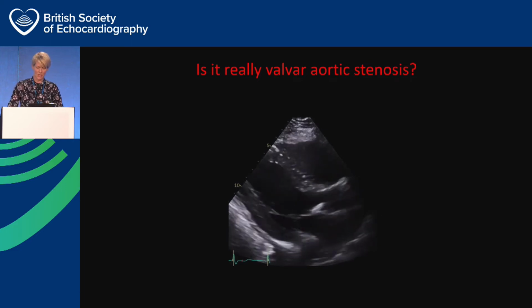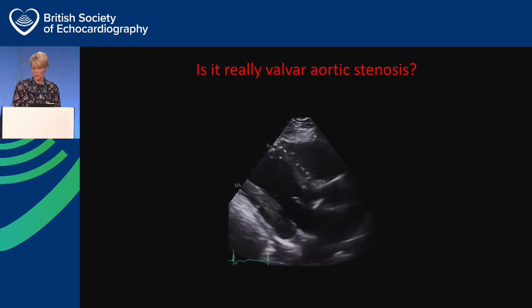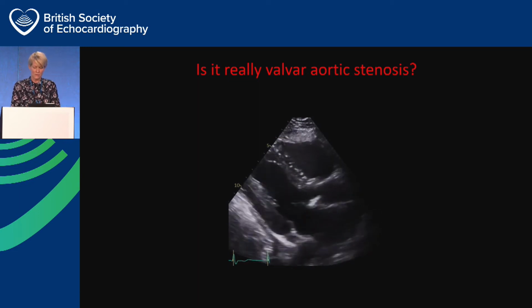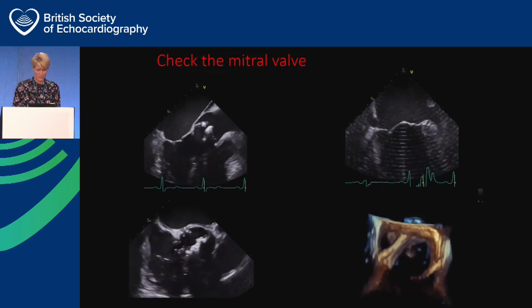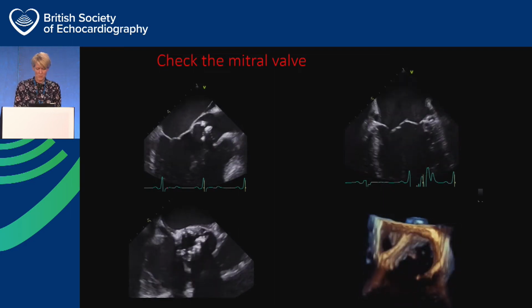And you'd have to enlarge the annulus, do a Konno, enlarge the LVOT, which is major surgery, and there may not even be enough space to get a good result there. This is a patient that came along to us from Cardiff the other day. He was a bit breathless.